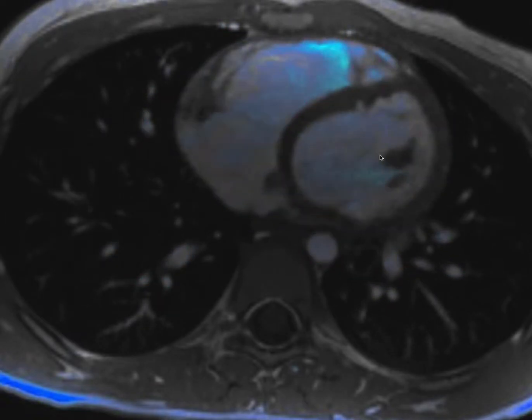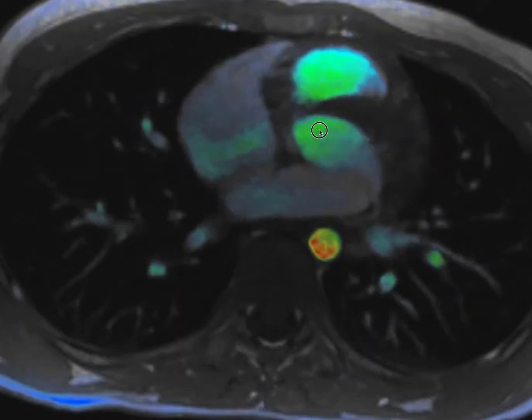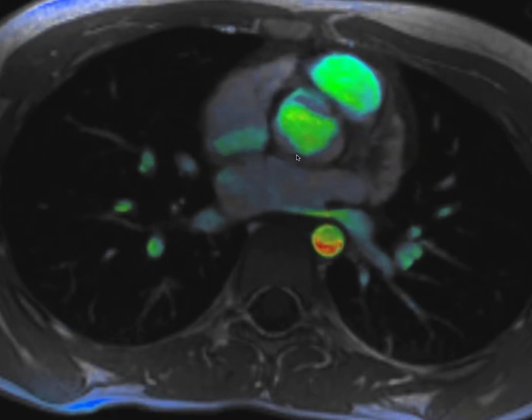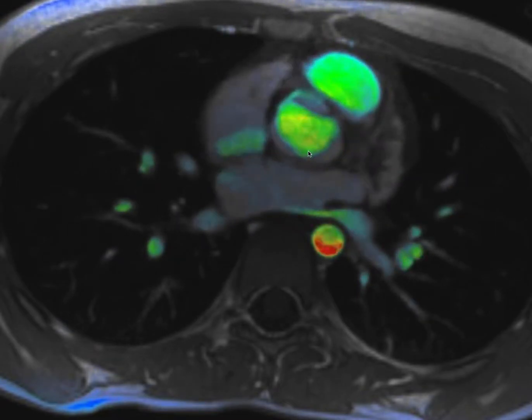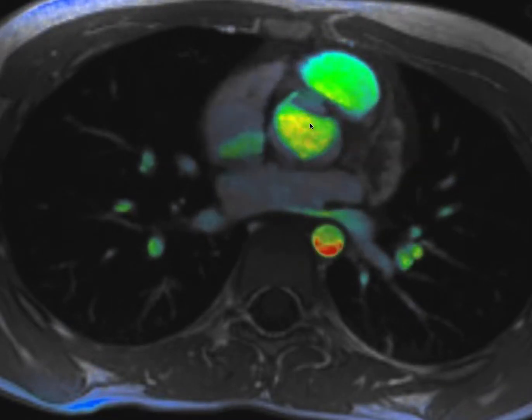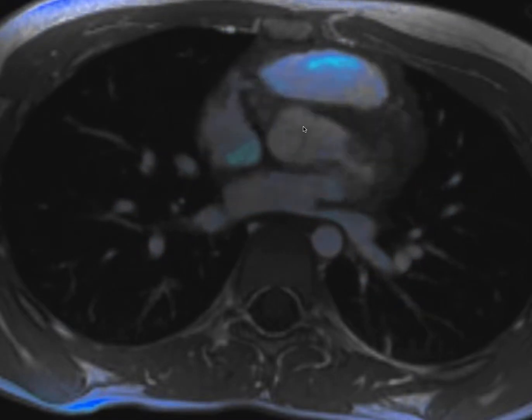So now as blood has come in, it has to have a way out. If you'll follow here, we're going to come to the aorta. This is the aortic valve right here. Notice that it has 3 leaflets, just like the pulmonary valve. This is taking blood out of the left ventricle. It's now oxygenated, and from the aorta, it goes through systemic arteries to all parts of the body.